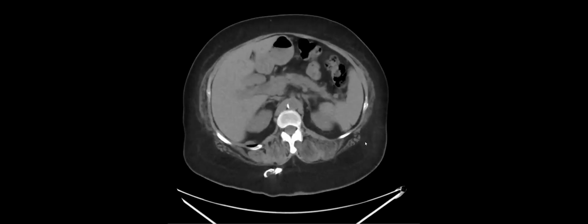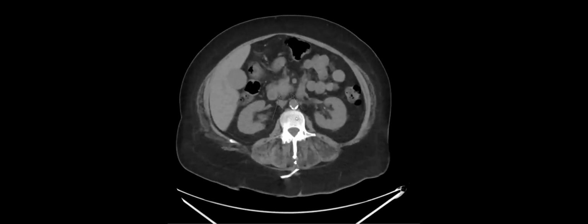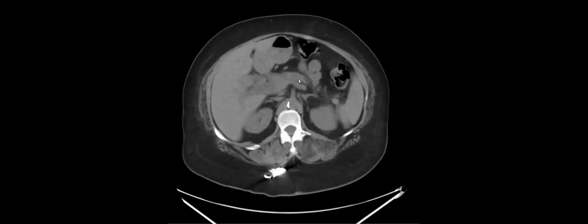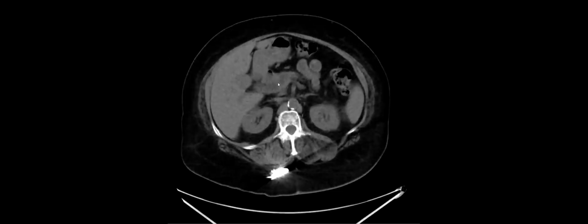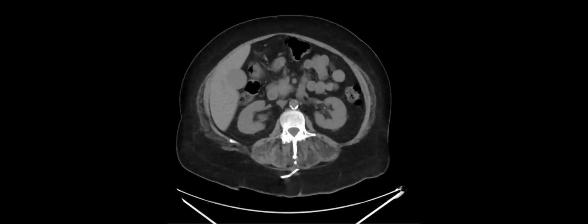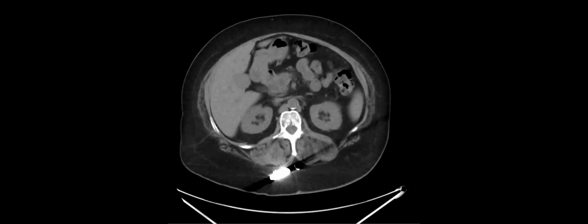Here's just another companion case. Again, there was a little bit of stranding near the tail of the pancreas, near the head. I thought this was a really good call because this one's a little subtle, but the pancreas is atrophic. And here you can see, if you narrow the windows, you've got the double duct. And then it kind of disappears here. This was a non-contrast exam for abdominal pain. If you're not looking, you could miss that, but it was called. And then the patient got an MRI.